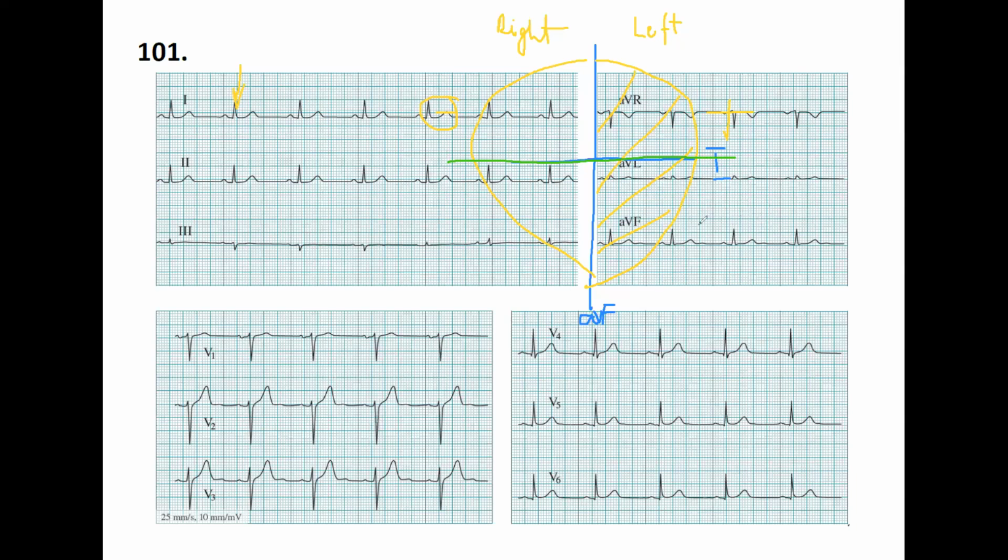AVF in this situation is positive, so where the AVF is positive, it's right here at the bottom. And AVF is negative all the way here. This is two different situations for AVF. Because we have a positive AVF and a positive lead number one, we have to choose the common part.